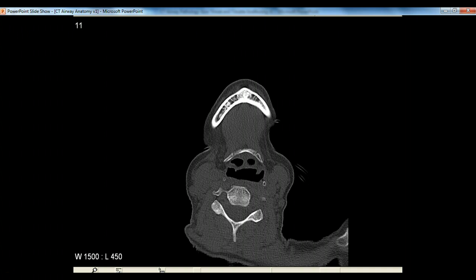And so it's often referred to as the master bone for airway management. That's because wherever you move that, you will move the soft tissues of the airway. So if you're trying to decrease turbulence, if you're trying to open an airway, you will lift it anteriorly. That is an incredibly useful thing to be able to do, because when you do that, you lift up all those soft tissues and you open everything up.